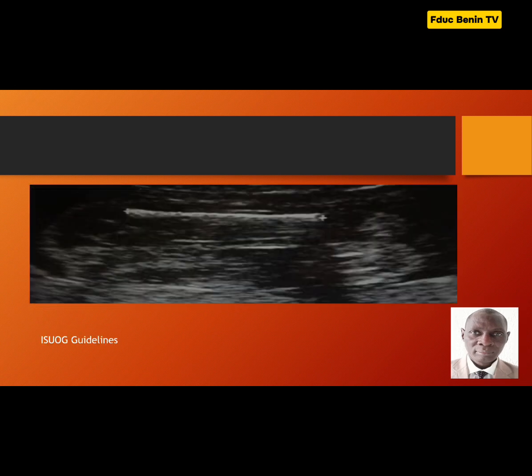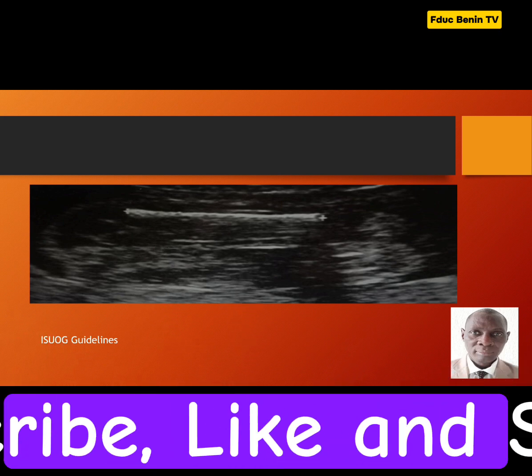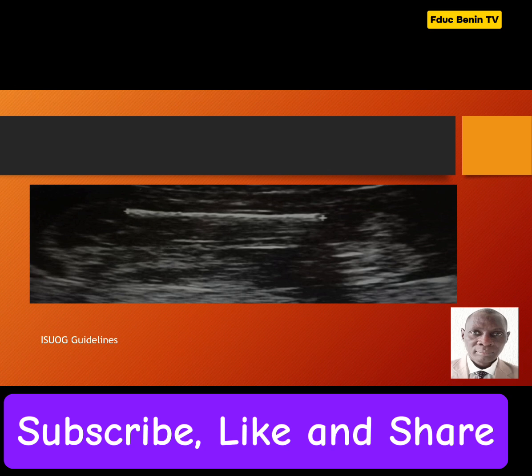Now, if you look at this image, is an ultrasound image of the femur. The bone, you can see, is in horizontal position. And you can see that the bone is well ossified. And the calipers are placed at the two extremes, depicting only the diaphysis.